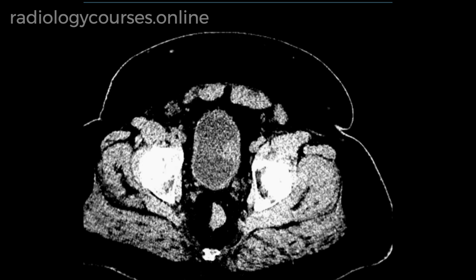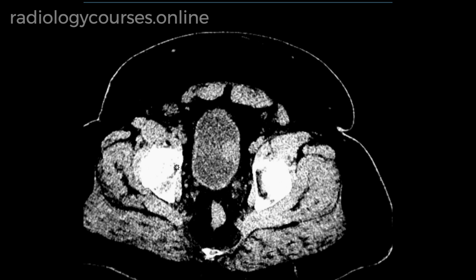So what I usually do in abdomen pelvis is I've got another setting which is 110. This is not described much in the literature, but I do this to highlight the change in the lumen and the soft tissue density.